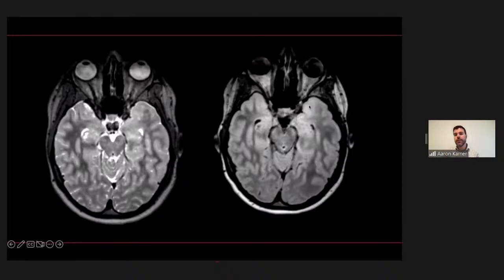Sometimes I feel like I have a hard time seeing the cortical thickening and cortical blurring, but the white matter abnormality is a little bit more evident. So compare, when you're looking at the temporal lobes in an epilepsy patient, compare side to side the temporal white matter, especially on either a T2 or a FLAIR sequence.